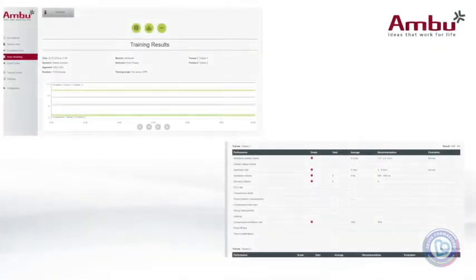The Team Debriefing tab provides the training results and scores for each trainee individually. The results can be printed or saved to the mannequin's hard drive. The instructor can select which items are important for scoring and the tolerances that they want to test on when configuring the mannequin for the training session.